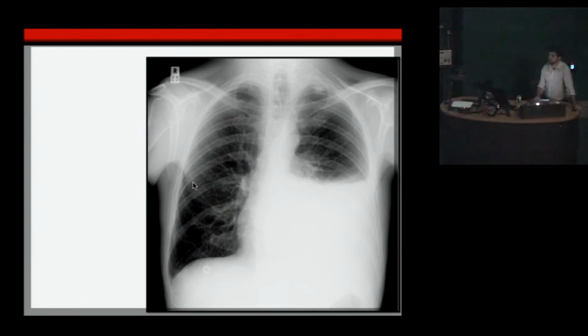So this is the sort of one that, imagine if you walked into an exam and you start talking about the bony abnormalities, the inspiration, and you talk about everything else, and then you come on to the bit where you talk about the abnormality. I think it's just a bit more mature to say this is the main abnormality, and then I'm going to go through my systematic approach.